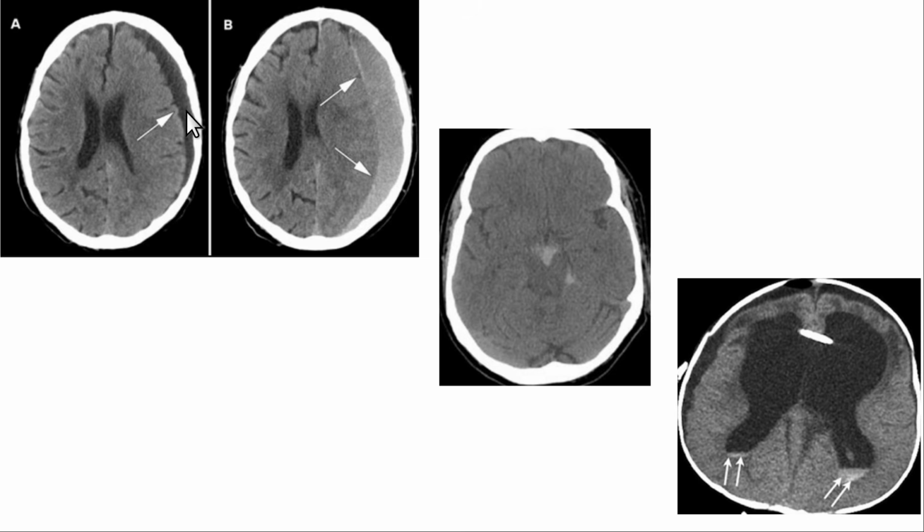Okay, so this is a chronic subdural hematoma, and this is a more subacute subdural hematoma. It's not quite as dense. The typical dense bleed is more dense like this. This is a little intermediate density. You can see the mass effect.